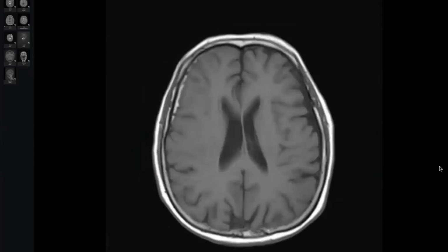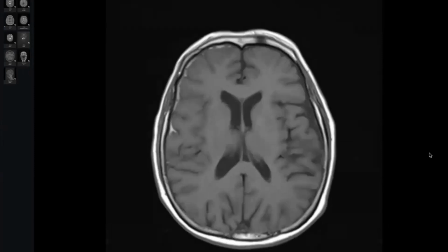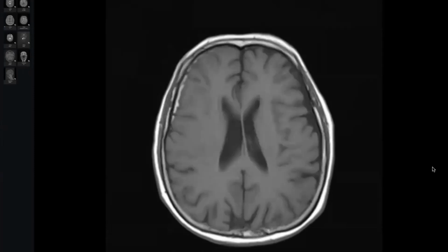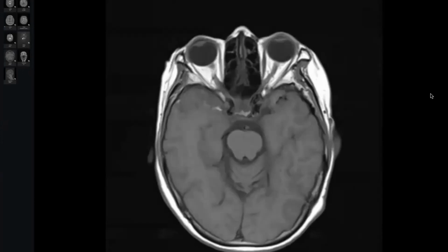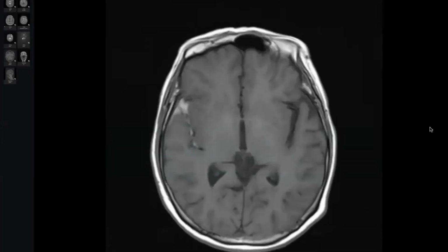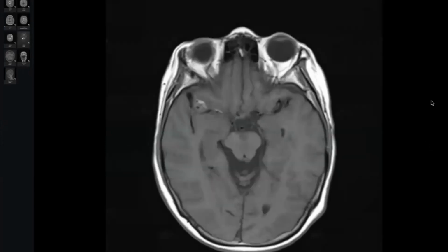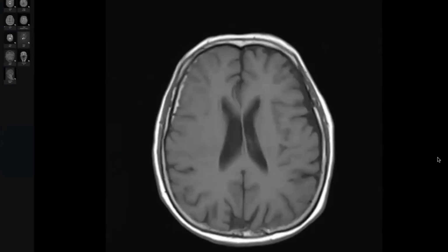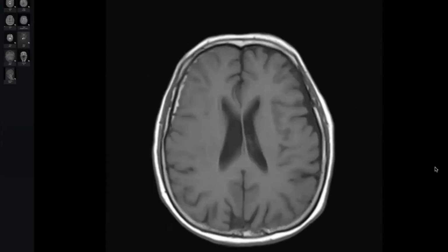There is evidence of hyperintensity along the right cerebral convexity in the frontal and temporal regions, as well as in the right sylvian fissure. It is T1 hyperintense, so it likely suggests hemorrhage, but I will confirm it on the susceptibility weighted image.